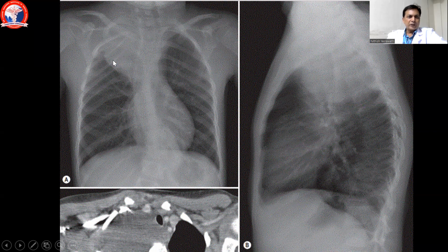What is an important finding on the radiograph is splaying of the ribs, upward displacement of the clavicle. The first rib is also upward and laterally displaced. At some point here, there is rib crowding also seen. So this lesion is causing deformity of the ribs. Spinal curvature also has changed here, upper spinal. So this is actually plexiform neurofibroma.